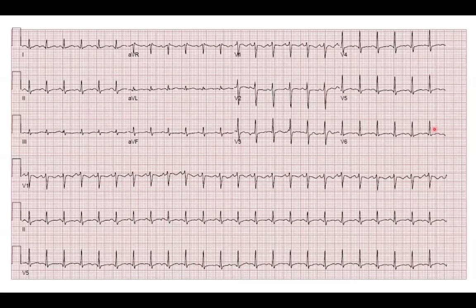Great. All right, and then we just have a few practice EKGs to wrap up with here. So here's the first one, and just like before, you can go ahead and pause the video to take a look.